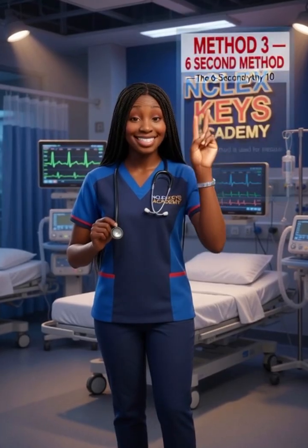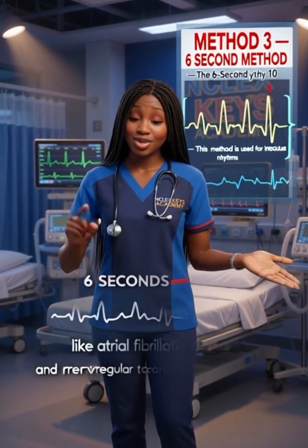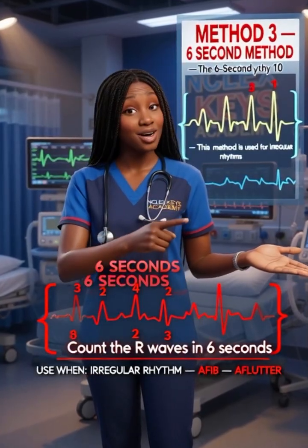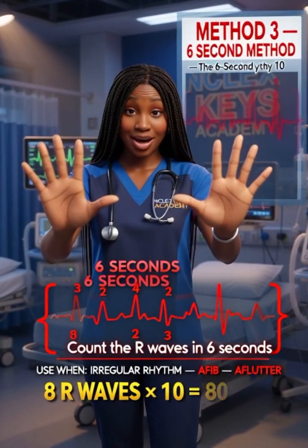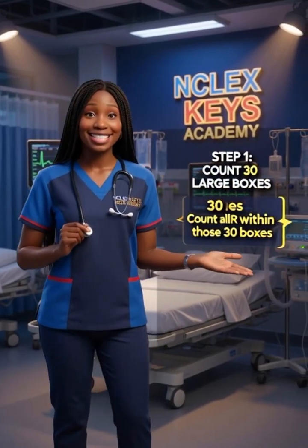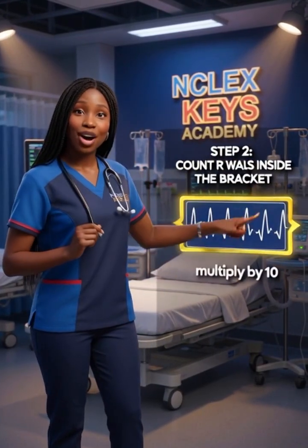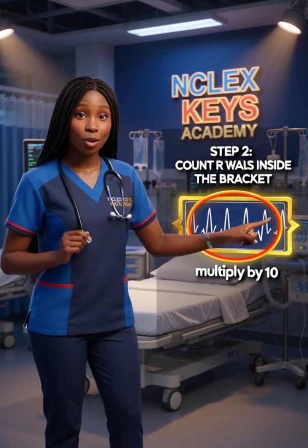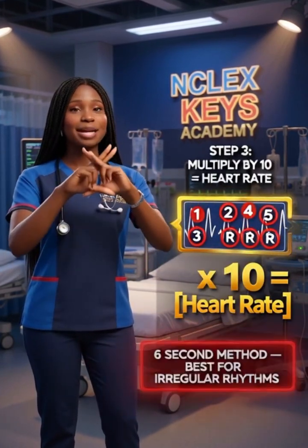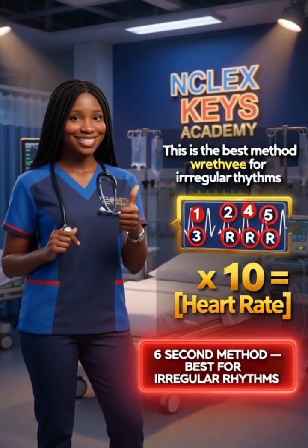Method 3, the 6-second method. This method is used for irregular rhythms like atrial fibrillation, atrial flutter, and irregular tachycardias. Count the R waves in 6 seconds, then multiply by 10. How do we find 6 seconds on ECG paper? Count 30 large boxes, count all R waves within those 30 boxes, and multiply by 10 to get the heart rate. This is the best method for irregular rhythms.